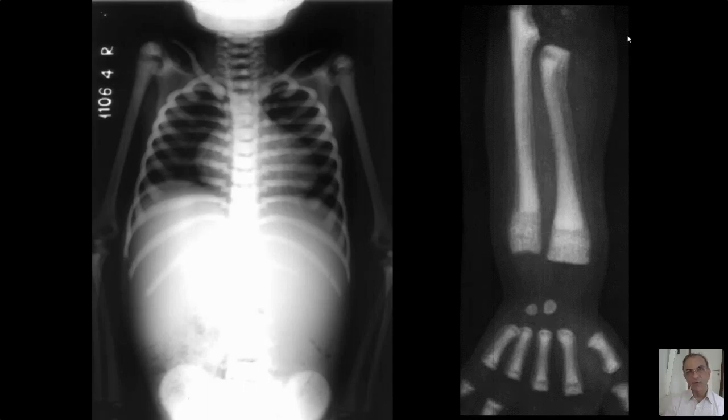And it's common. In our country, it is common. So you should be able to tell osteopetrosis from pycnodysostosis and cleidocranial dysostosis. One way is to look at whether there is organomegaly or not. If it is present, then it is not pycnodysostosis or cleidocranial dysostosis. That's fine. We are looking at bones.